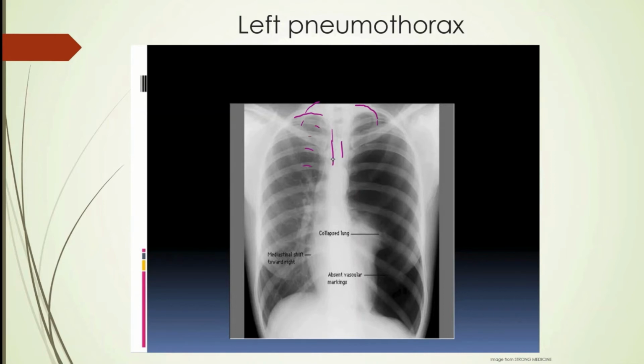And the carina should be between the 5th and 7th vertebral body. So the carina should be between here. And again, if you have your ET tube once again above, or about the level of the clavicles, you should be okay. But this is another way of determining approximately where the carina is.